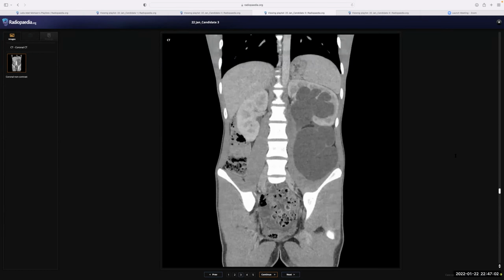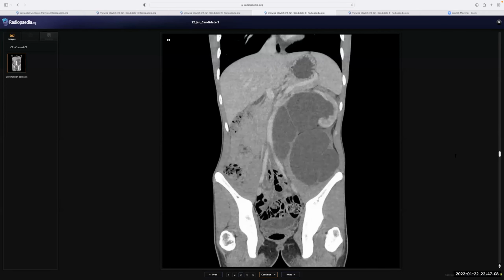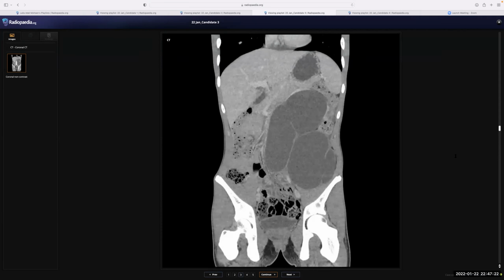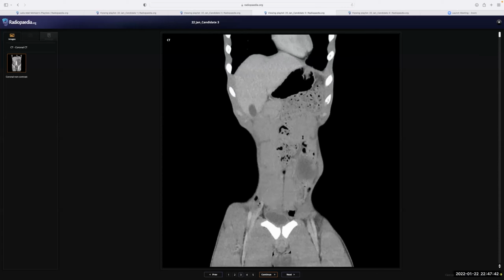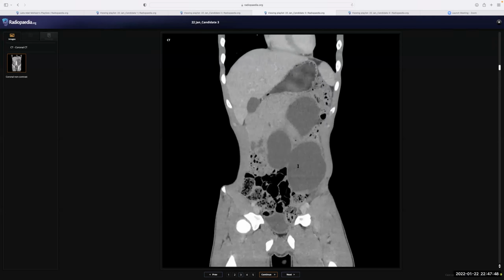I think this is part of the ureter, also hugely dilated, or mega ureter in the region. If there are axial images, I can display it much more, and I will understand the situation much better, because it is extending down to the iliac fossa, iliopsoas fossa, and there is mild septation within it. So this is a septated lesion which is continuous with the kidney. Okay. If you follow the images here, I feel that the ureters are continuous together. So I believe this is a ureter.